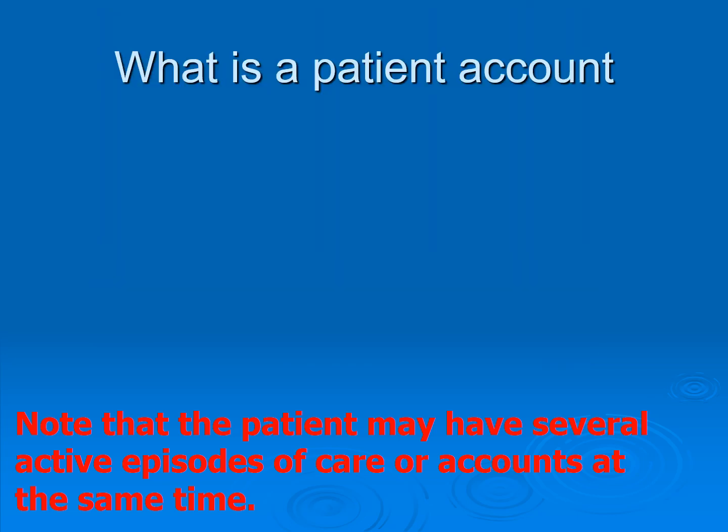When you have selected the correct account, it should reflect the location of the patient at the time of the examination and the consultant to whom the results will be sent.